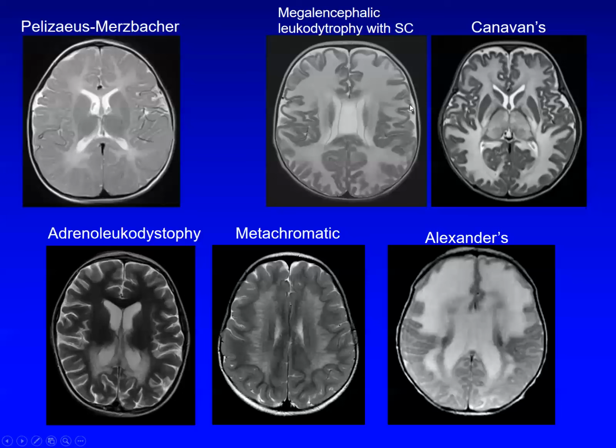So these are both patients that have macrocephaly, and they have more of that peripheral pattern where the subcortical white matter has relatively early involvement. They also generally both look like they have edema early in their disease process, so it looks swollen.